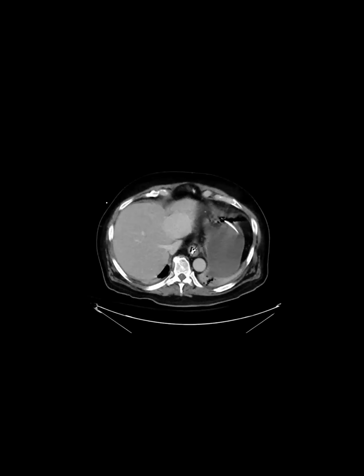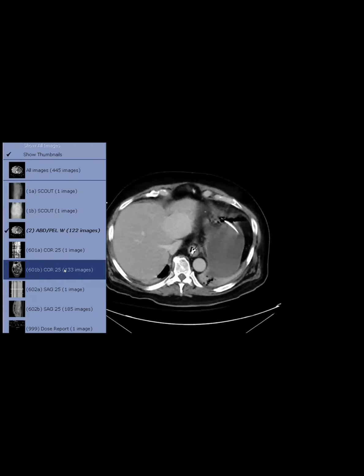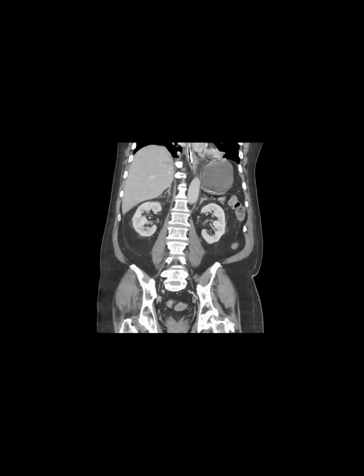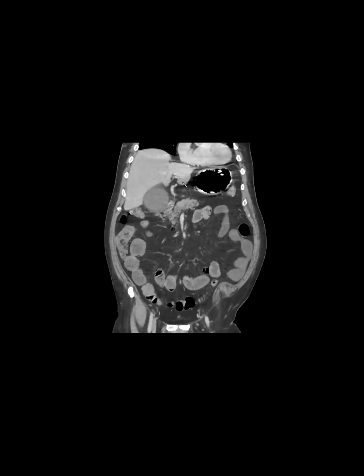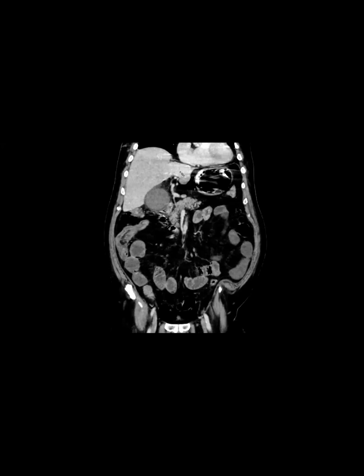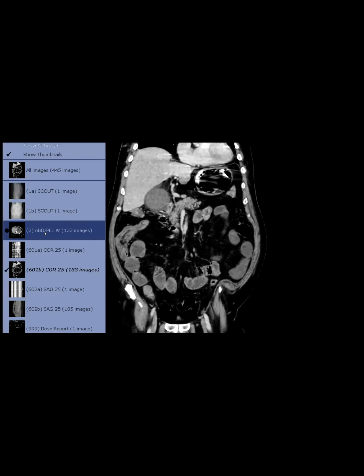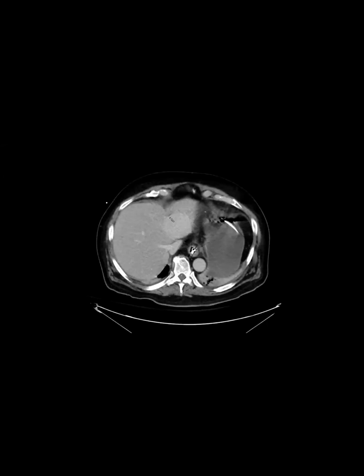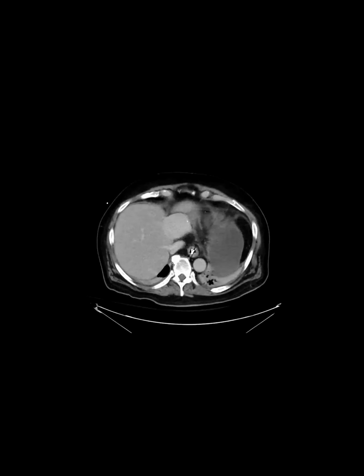So we biopsied this and it came back splenic tissue. And you could say, is this intrahepatic? We were calling this intrahepatic. When I looked online, every case of intrahepatic splenosis that's published is always at the capsule. So I actually think it's probably subcapsular or capsular splenosis. But yeah, this tricked us.